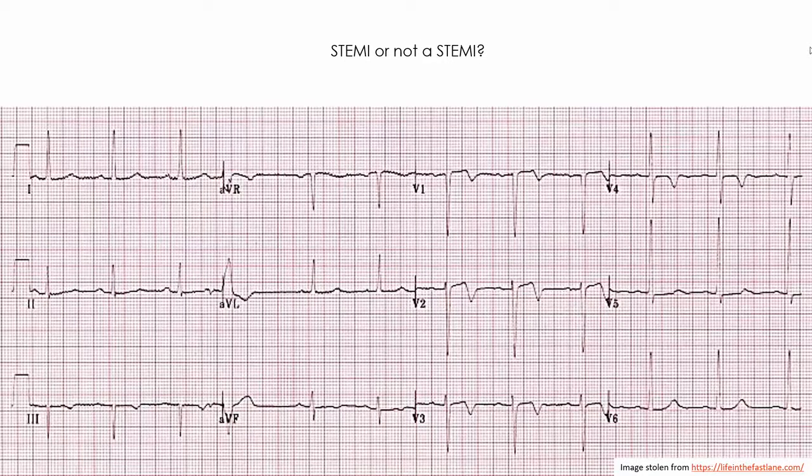Moving on to this example, is this a STEMI or not a STEMI? I'll get you to pause the recording here, and then I'll talk you through it.